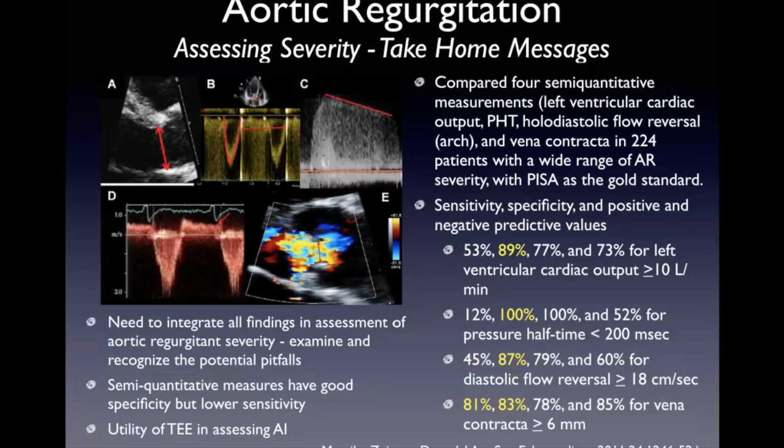Yeah, no, I agree. So just make sure everyone online heard Dr. Conley's comments. The first comment, with regard to assessment of LV dilatation, particularly LV volumes, 2D. If you're lucky enough to be able to do 3D, then probably even better. It's one of the parameters we look at for severity of the AI, and it also helps in terms of driving intervention, because we know there are cutoffs for LV dimensions about when to intervene upon severe AI in asymptomatic patients, for example. There's a severity index that Geraldine studied as well, and then the PISA assessments.